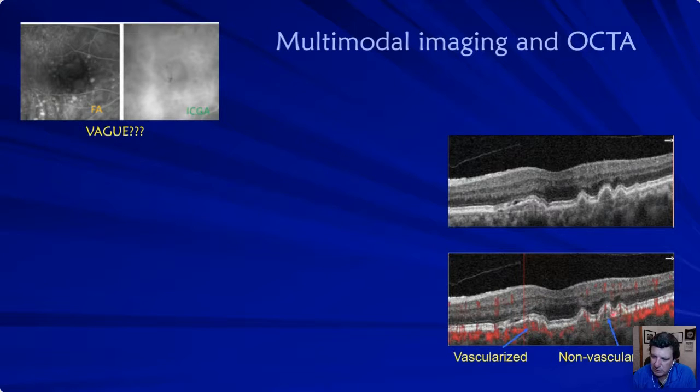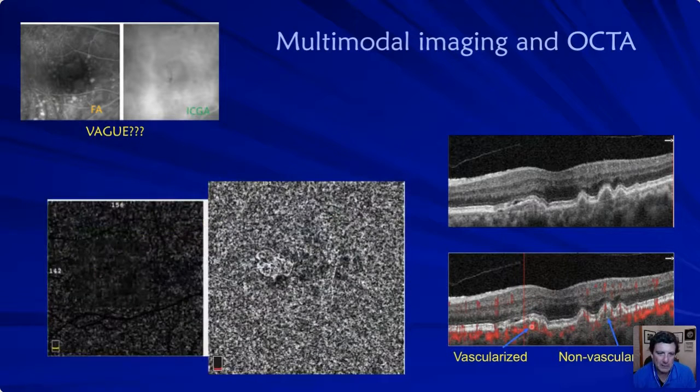The drusen should not be vascularized like this drusen is becoming vascularized here. You can see that the blood is kind of moving up into this area, and there's nothing above it. Sometimes you can get a little reflection down from above, but this looked very suspicious. So we decided to go over and do a 6x6 scan.